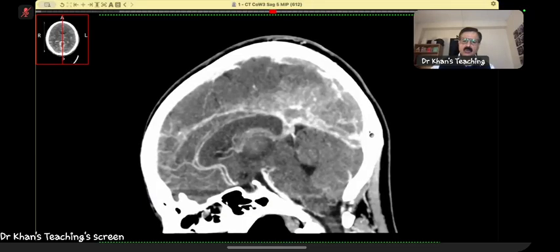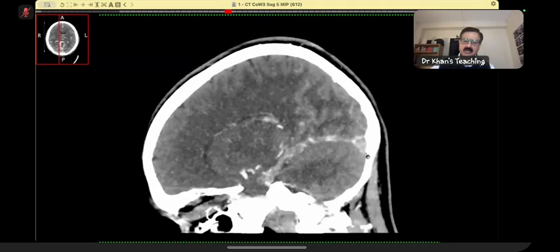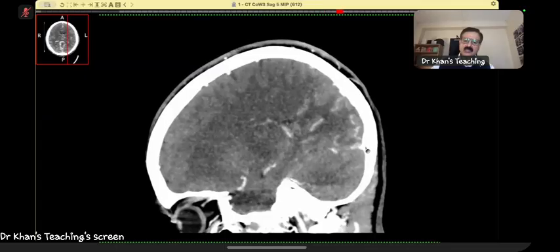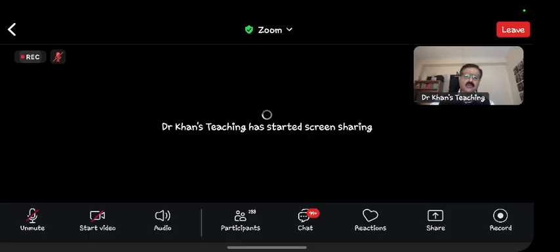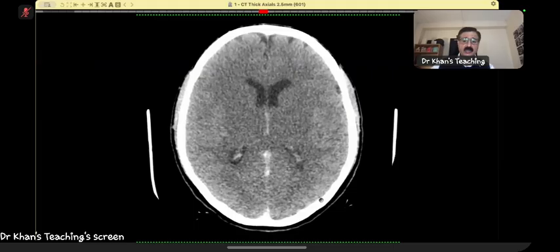Now, here you are. Even the straight sinus filling defect is visible. Go to right and left, and now I'm going to one side, and you can see this filling defect in the transverse sinus. Go to the other side, and this one is a hypoplastic sinus. It's a normal variant, and the main filling defect is on the other side. In this particular case, I did not show you the CT, but the CT is an exam case. I think in my teaching I have shown you similar cases, so I just wanted to show you MR, and I knew that you would find it difficult.